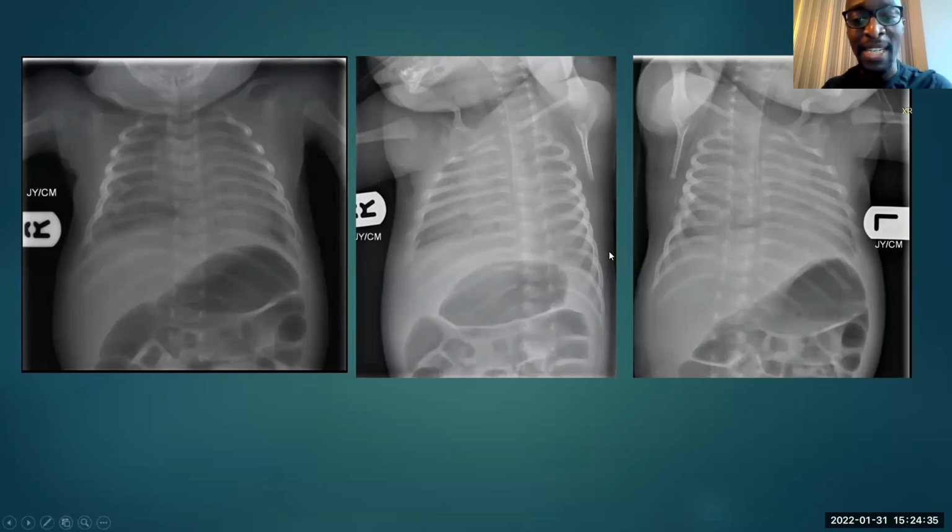So why am I showing these additional pictures? Because as part of a skeletal survey, we do these additional views of the chest. The child is placed in an oblique position. What we used to do is collimate very tightly so that you only see one bit of one side of the hemithorax. Actually, these really amazing radiology academics, when they looked into it, said the dose between doing very tight collimation and getting this extra bit of the chest is negligible.